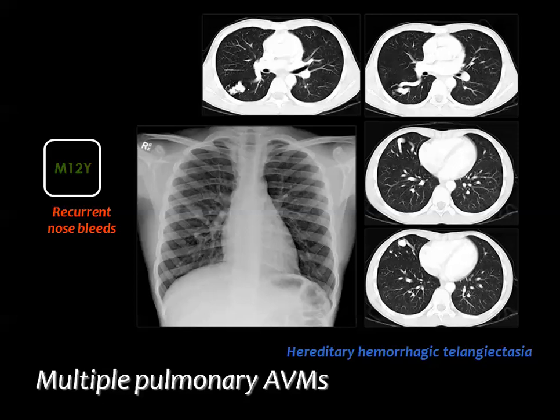It is better to see the arterial and the venous drainage, two cords, but if you see only one, this is enough for the diagnosis of arteriovenous malformation, because the second cord may not be shown in the same section. It may appear in the previous or the next section. Then you see this is an arteriovenous malformation in the apex of the lower lobe. You remember the tracheal bifurcation. This is the upper lobe and this is the lower lobe. And this is the arteriovenous malformation which can be seen here.